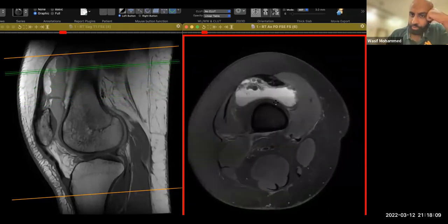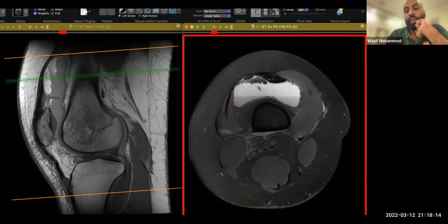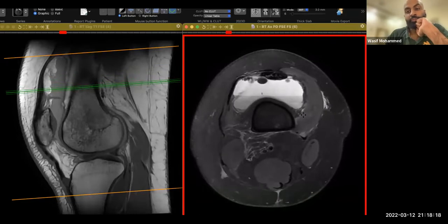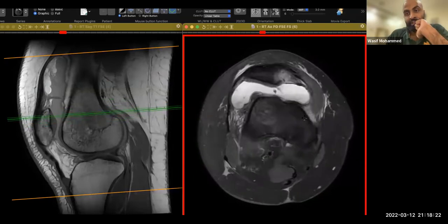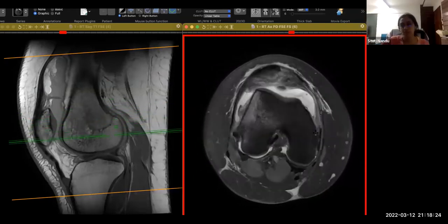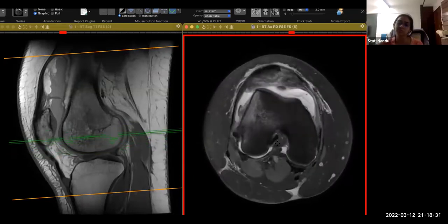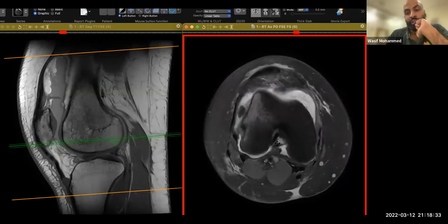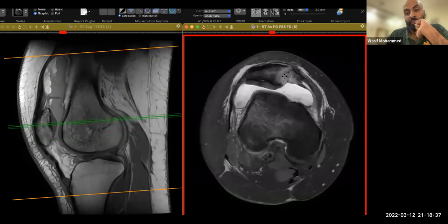Did you say osteochondromatosis? Yes, you said synovial osteochondromatosis. So loose bodies in synovial osteochondromatosis will not just hang on to the anterior surface in this manner, would they? Okay. No. But I asked you to show me the loose body because there was a loose body in this case. It's here. Okay. It's like hiding in the corner. Okay, this is the detached patellar fragment from here.